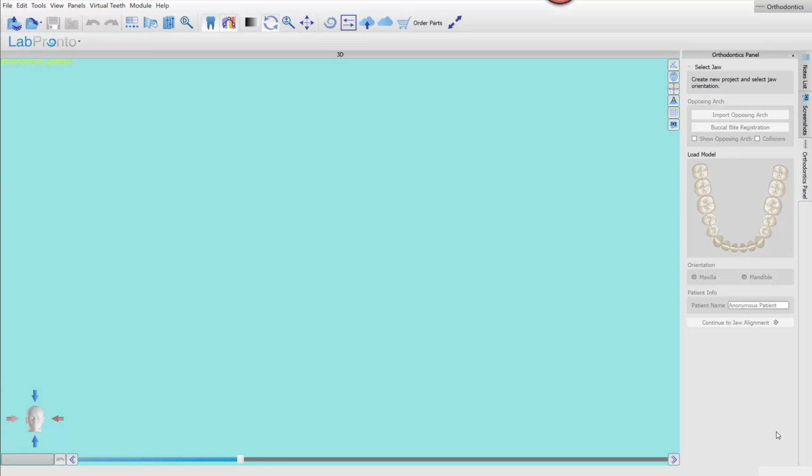So this is not going to be going over all the minute details. We've got plenty of other videos that go over that. I'm just going to walk you through how things should be set up so that someone can come in, finalize the design, and then output the models. And you'll see how I go with this.